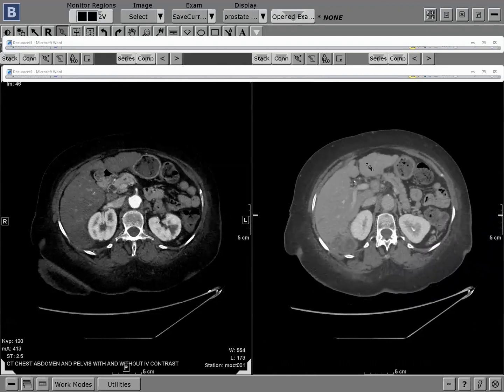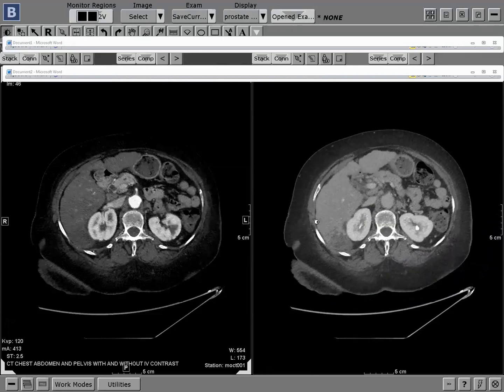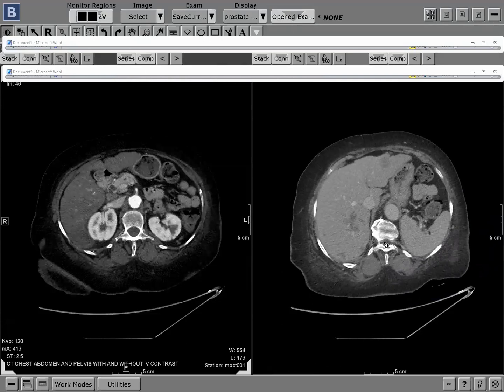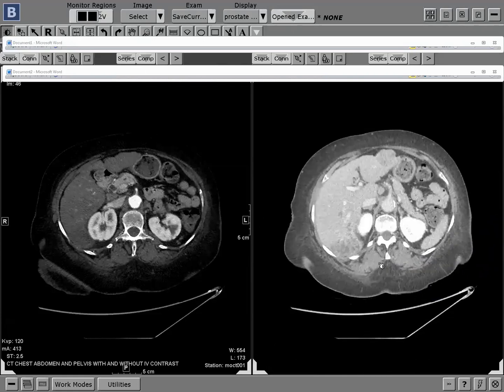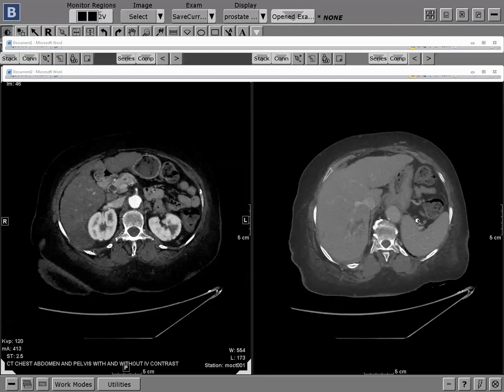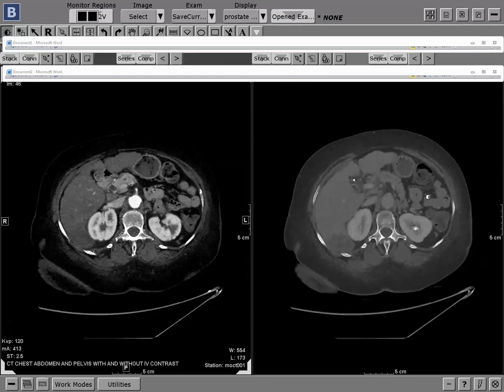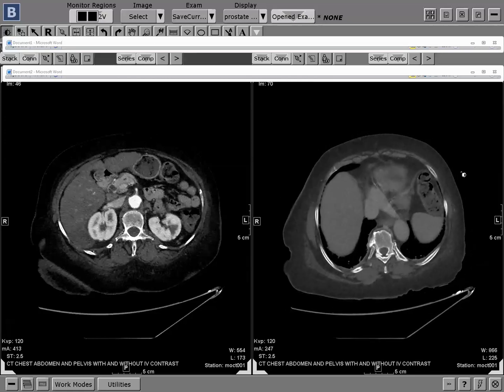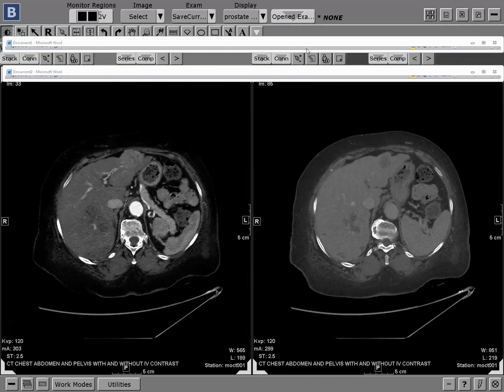That's really cute. Pretty good case. I've seen cases like that after liver transplant, where they have acute liver injury, for example, and that's what it looks like. But it's usually after transplant. So we don't generally think about liver infarcts because the liver usually has dual supply, but I guess she's cirrhotic. I guess she has a priori altered liver perfusion, and she clearly has a hypercoagulable state. Anyway, I don't have slides for the cases, but it's just a very unusual, interesting case.